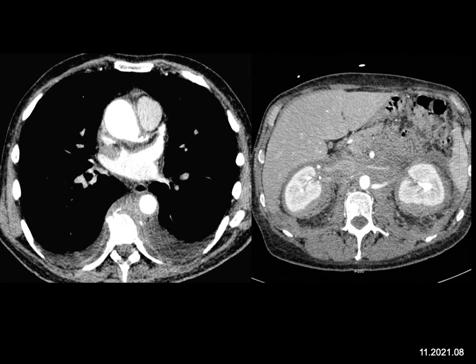Retroperitoneal fibrosis can involve both the chest and abdomen, but the perirenal involvement is not what you're going to see with retroperitoneal fibrosis. And sarcoid can give nodes in the chest and abdomen. Posterior mediastinum is not the best thing for sarcoid, but it's not infiltrating into the mesentery like this. What else can you think about? Well, Erdheim-Chester disease is the thing you want to think about. It can present, and it's classic for perirenal space involvement.